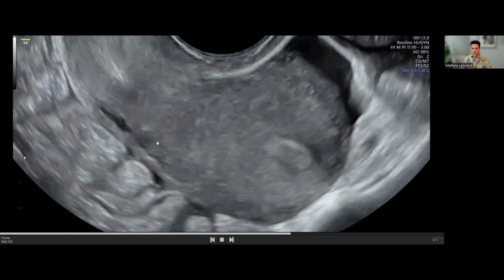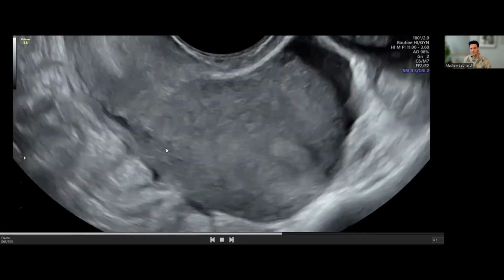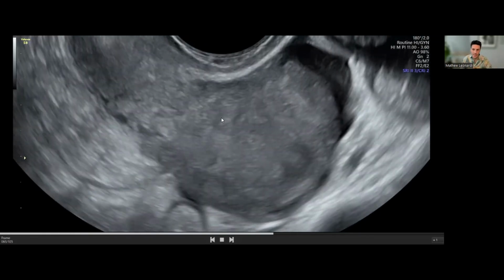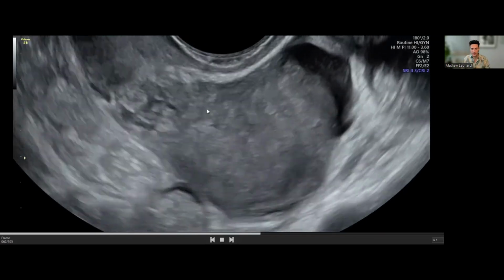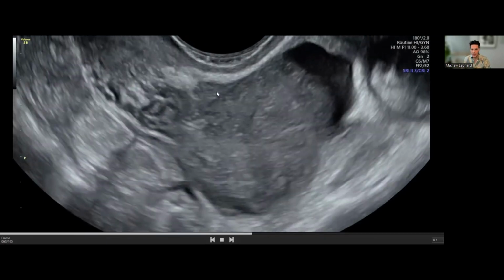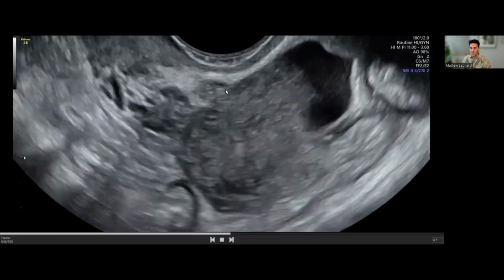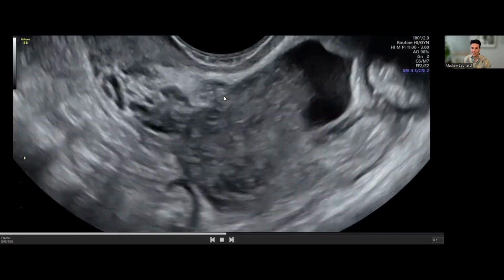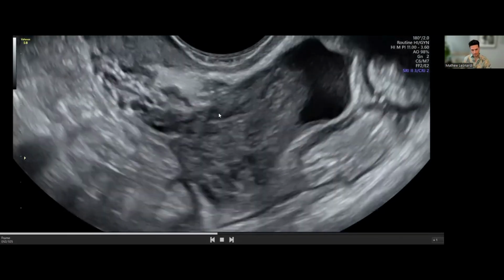I believe that it is really important to count in almost every patient. If it is very clearly subjectively abnormal with 30, 40, 50 follicles, maybe you don't need to count. If it is clearly very subjectively less than like 1, 2, 3, 4, 5 follicles, then don't count. Anything in between, I think you should count, because you'll be surprised. I think that the report of polycystic ovarian morphology is under at this point in time, because most people are not routinely collecting cine loops, and most people are not routinely counting in every single patient.